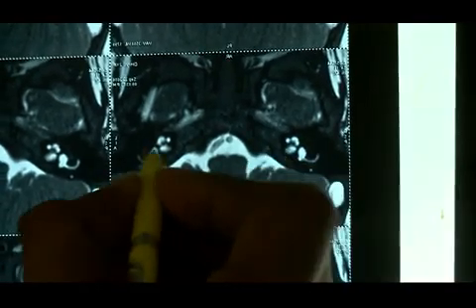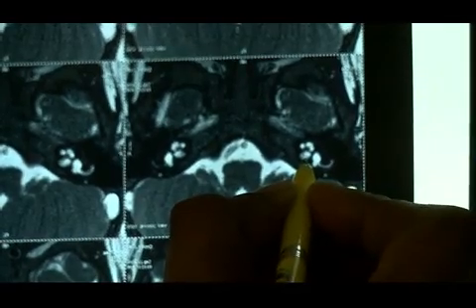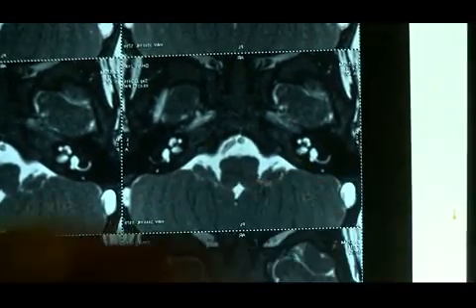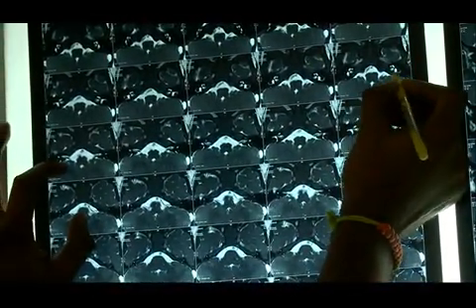What you see in MRI is the T2 weighted image, which gives you a clear picture of the fluid in the cochlea. Can you see this? Yes. Can you see both sides? Yes. And this is the cochlear nerve. Now see inferiorly, these are two nerves, the sections are too wide, jumping.